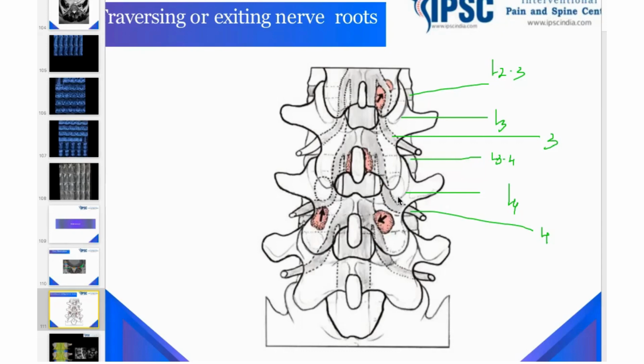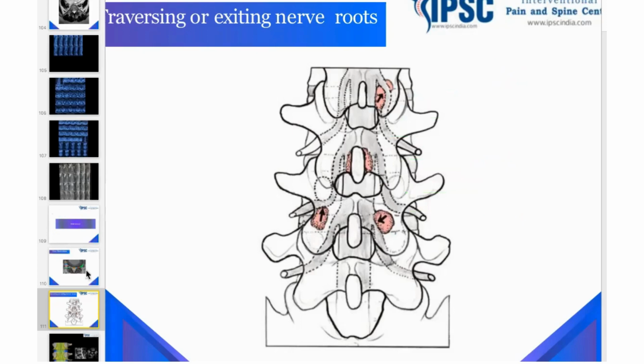Look at the space here. But here, there is no space. Okay, now everything is clear.